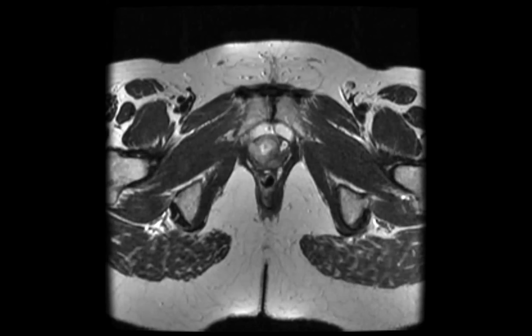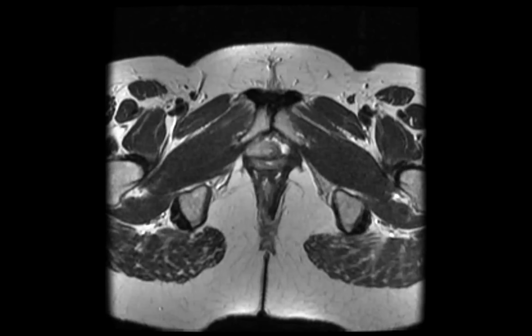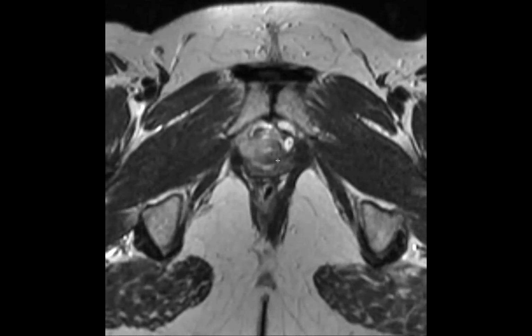Here you can see this is the urethral wall, and then you can see the tumor extending beyond the wall into the adjacent muscle. Stop down one. It's a good example of the targetoid normal appearance on the patient's left side, and then the loss of the normal targetoid anatomy on the right side. Yep. The internal and external sphincter is what creates that targetoid appearance. And this was a proven urethral cancer.